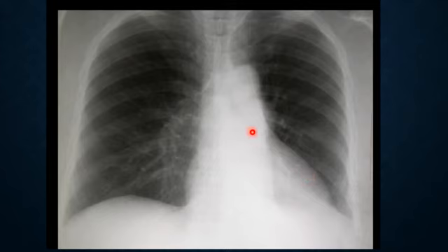Yeah, the left ventricular enlargement. You mean any ventricular aneurysm? The left atrial enlargement, you will lose the aortic knob only. Left ventricular enlargement, you will have prominent heart apex. Here it is, the whole thing is lost.